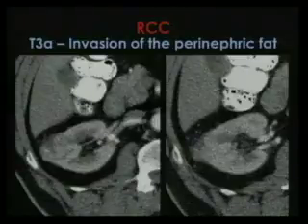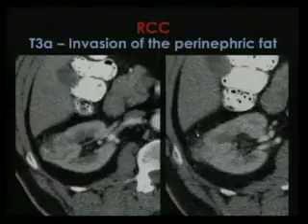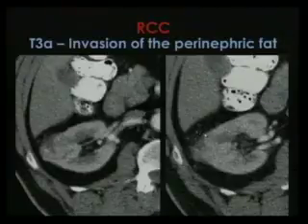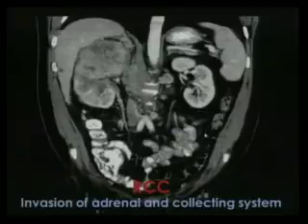Let's see examples. You see, we have a tumor in the lateral aspect of the right kidney, and we can see at least 3 nodular-appearing abnormalities in the perinephric fat, and this is compatible with invasion of the perinephric space.